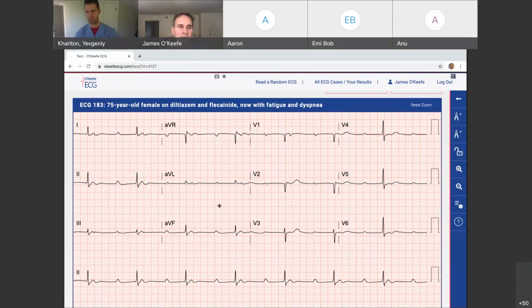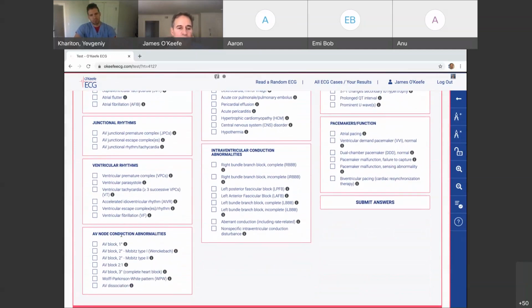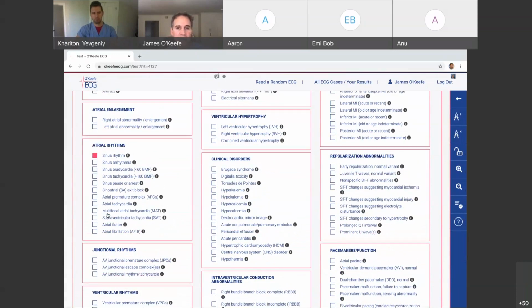You could tell this is somebody who doesn't have a cardiomyopathy. Lots of times, if you see high grade AV block, you'll see QRS abnormalities, a widened QRS, whereas this has a nice narrow normal QRS, and sure enough, when we stopped the antiarrhythmics and the diltiazem, it just normalized right up. The thing about 2-to-1 AV block is you don't know if it's Mobitz 1 or Mobitz 2 if it's 2-to-1 the whole time. So in this case, you just do sinus rhythm and 2-to-1 AV block, and I think that's about it.